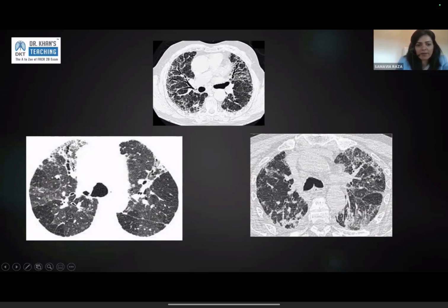In the context of the bilaterally, the lungs look mosaic. It looks like there's air trapping, so that looks pretty good to call somebody as chronic HP. And the reason I'm calling it as chronic is because I don't see any nodules. I don't see ground glass, centrilobular nodularity. So I know this is only chronic.